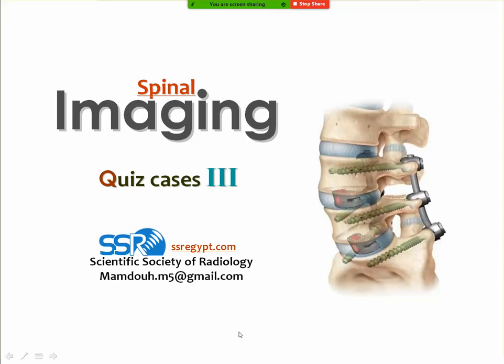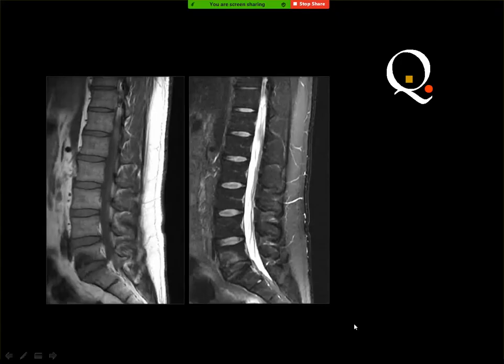Then we'll start with the first case, and here you can see an MRI T1 weighted image and T2 of the spine.